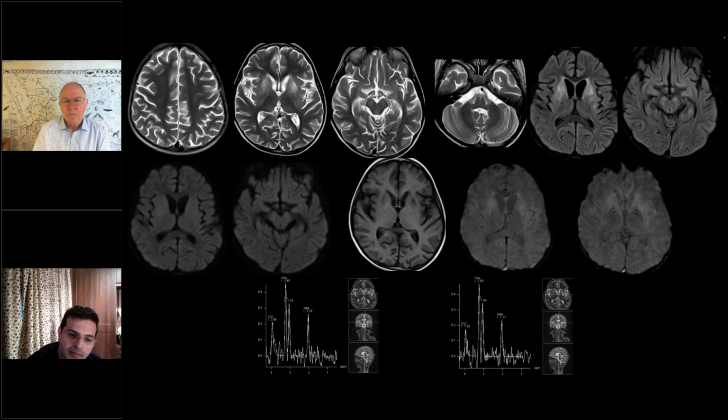But this is the second episode, right? I mean, is it? The same episode, ma'am. That's the same episode. This is the second scan. Okay. Yeah, second scan. Fine. The atrophy can be attributed to the steroids, I think. Was there atrophy in the first scan too? There was no atrophy in the first scan.